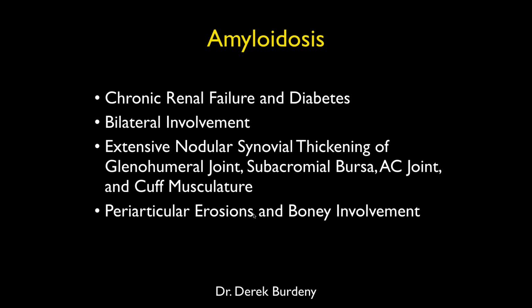If it was calcified, then you can sometimes get large calcified masses after trauma. You can look at hyperparathyroidism and multiple brown tumors, but you can have brown tumors also that aren't calcified. And this would technically be a brown tumor in the synovial, in the joint space, if it were hyperparathyroidism, which it's not.